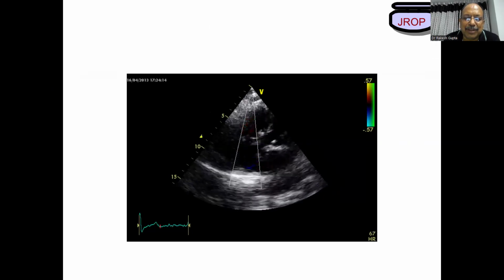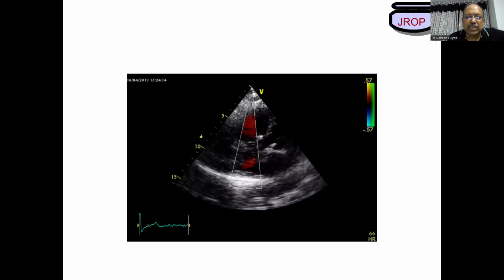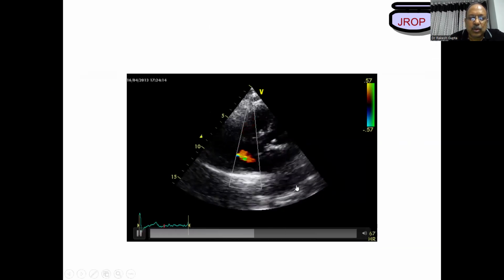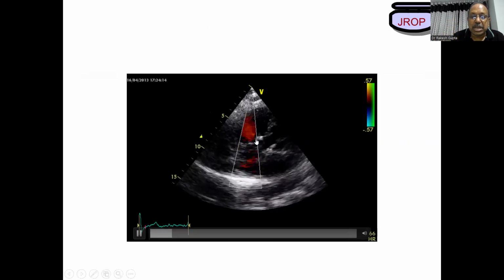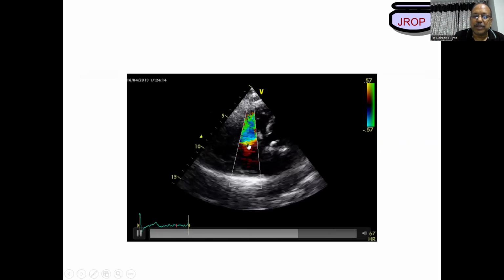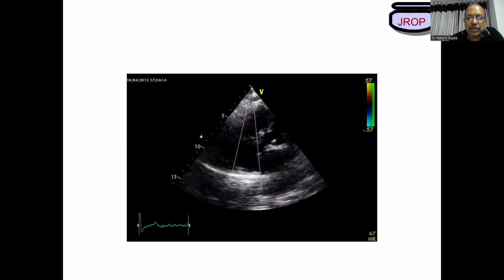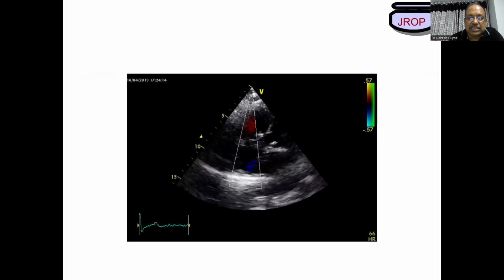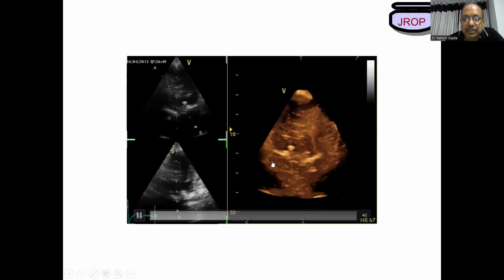So this is an example of a tricuspid bioprosthesis. If you look at this bioprosthesis, only the stents and housing will be seen, not the leaflets. Leaflets are biological leaflets; they could be either porcine or bovine. Now look, this is seen very carefully here in three dimensions.